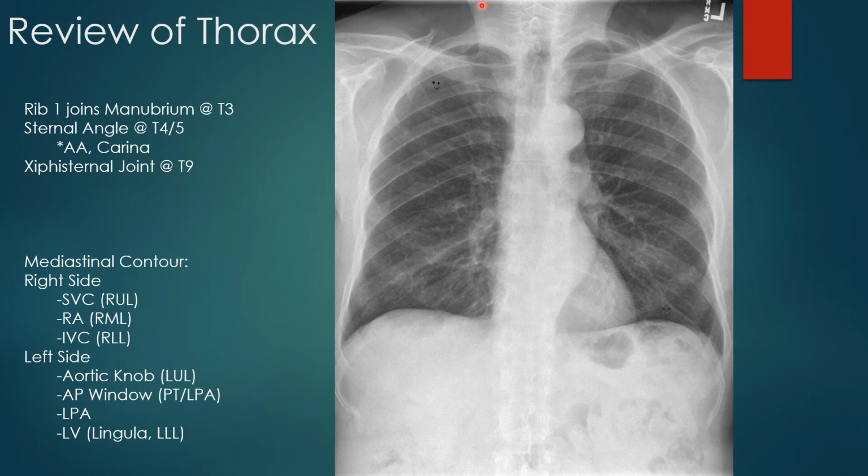Also, to drive home the point that it is important to go through systematically and appreciate all the structures. I'm sure all of you found this. If you paused the video and went through all the structures, you found this. But it is really important to go through systematically, make sure you don't miss anything, and a few of you might have missed this guy right down here.